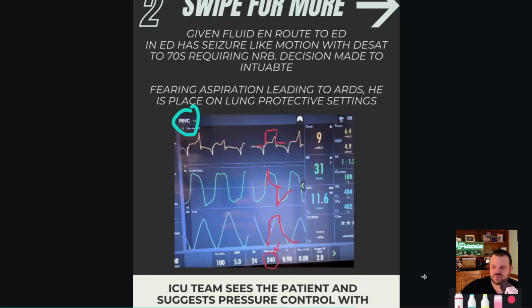And I think it's pretty clear that we don't see that, for a few reasons. One is that the pressure seems to be very, very low. It's almost like the PEEP. If you look at the peak inspiratory pressure, it's in the single digits, which should automatically raise some red flags. Now, some people might say, you know, these little upswings in pressure at the end, like there and there, but not as high, but there also. That doesn't necessarily represent the pressure during inspiration or the ventilator supplying pressure. What that represents is the patient pushing out against the ventilator, trying to get it to cycle.